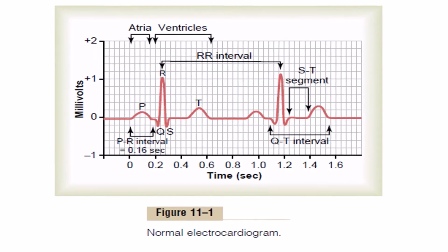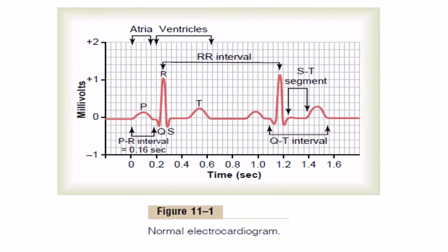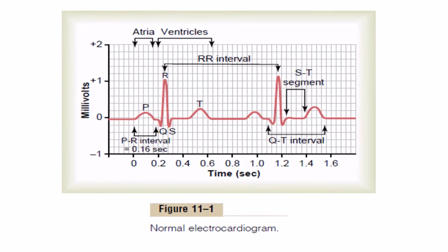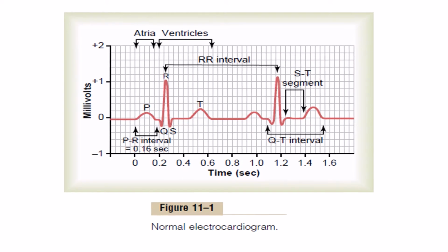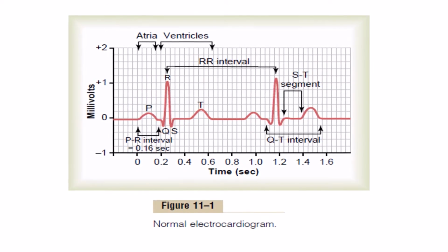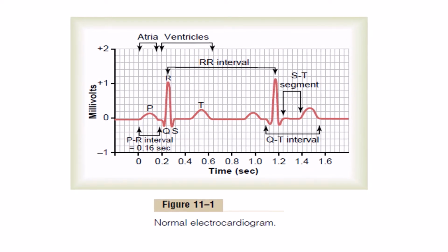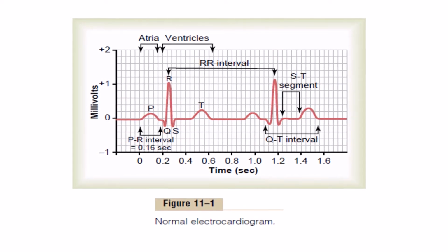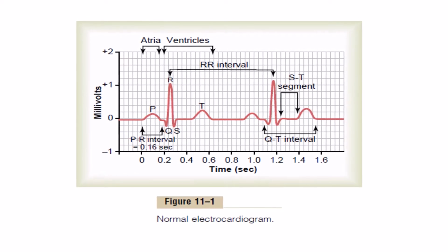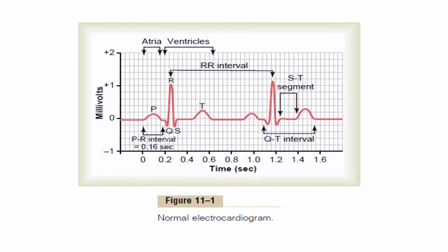This is one example of how we got that reading and a timing. There are certain things which you have to remember. What is RR interval? What is PR interval? What is QT interval and ST segment? There is a timing, and for more detail, a separate video is there for each segment.